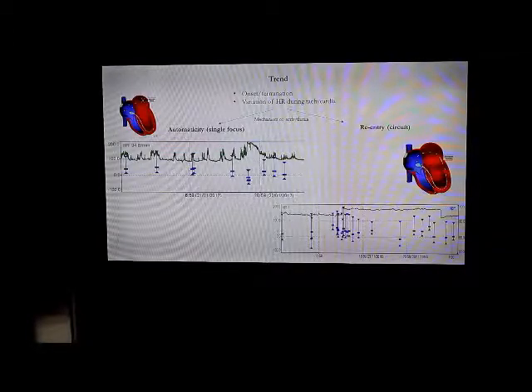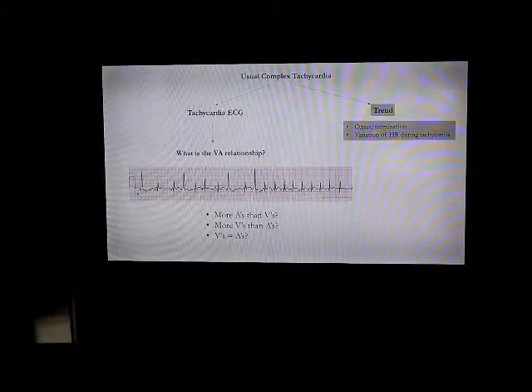So looking at the trend can help you differentiate, because when you take an ECG, it's just a 10-second snapshot of time. So it may look regular, but the trend actually would go with automatic. So if you're able to look at the trend, that will be very helpful. Most of the time you don't have a trend, so you just have the tachycardia ECG.